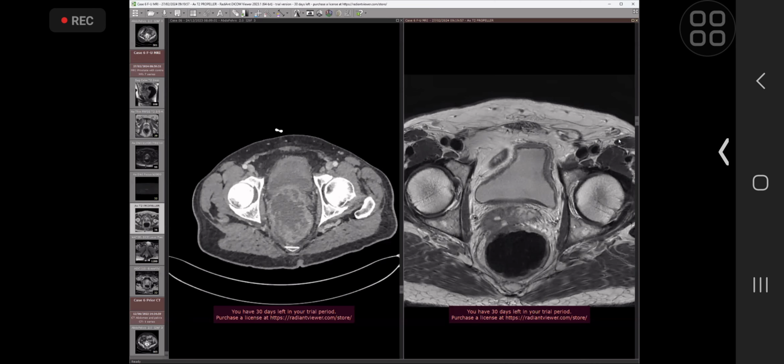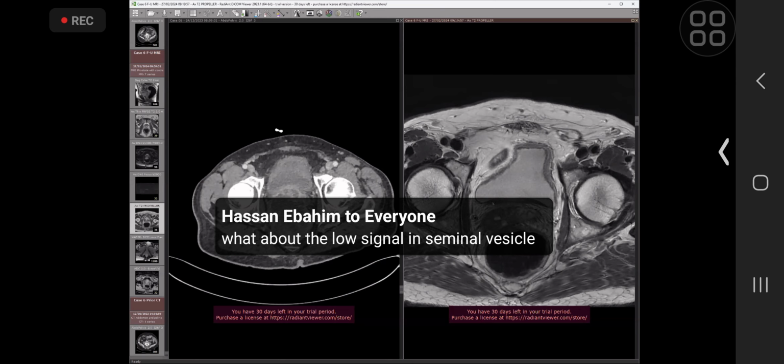But if there's a very strong history to suggest abscess, a trial of antibiotics prior to an early MR would be a reasonable thing to do, and then to assess for an unusual subtype of prostate tumor, or indeed a rectal tumor that's invading into the prostate, something like a mucinous tumor, you might think. Yes, with this low signal intensity as well, a low attenuation. So those might be the thoughts, but absolutely guided by the clinical history.